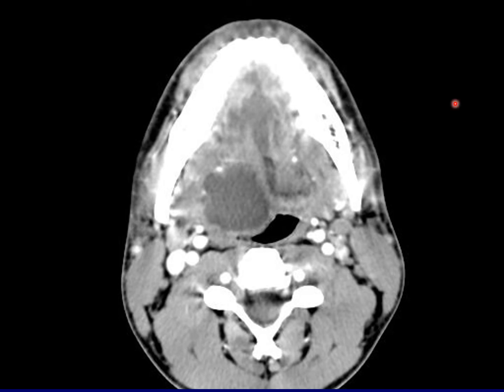Now, you might look at this mass in the base of the tongue and say, this is a very well-confined mass. It's got a nice, well-defined rim. Why should I ever suspect that this is a lymphatic malformation? And the answer is, look more carefully. Here is another aspect of the lesion that is infiltrating into the muscles in the floor of mouth. All of this is additional lymphatic malformation in addition to this rounded component. So that's how you can get to the exact diagnosis.